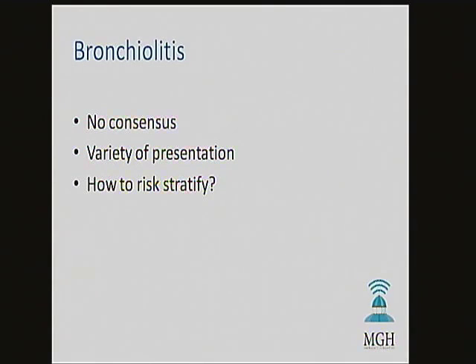Okay, so now we have a few other findings: the pleural line abnormalities, the consolidation, and the skip areas. Now we're going to think about it in more complicated terms, not just COPD versus CHF, but the full spectrum of pulmonary disease. One of the things that happens a lot in the north, in Boston, is we get bronchiolitis season where everybody gets a cold at the same time, and we get about 3,000 sniffly, coughing, crying 5-year-olds coming to the emergency department in the same week. And how do you know which of those kids are the sick kids and which are okay to go home?